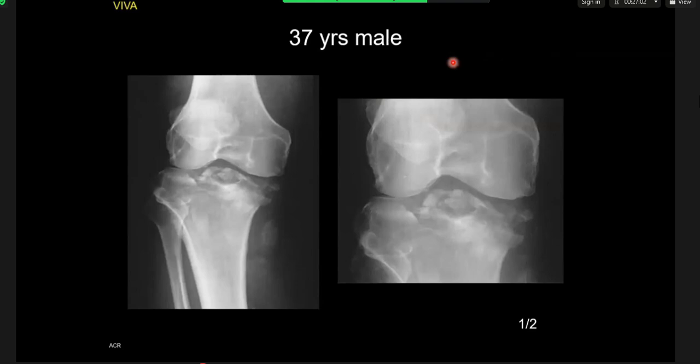There appears to be bone destruction, degeneration of the joint, loss of joint space, debris with increased density of the bone. My primary diagnosis would be a Charcot joint in the knee. My differential would be previous septic arthritis of the knee.